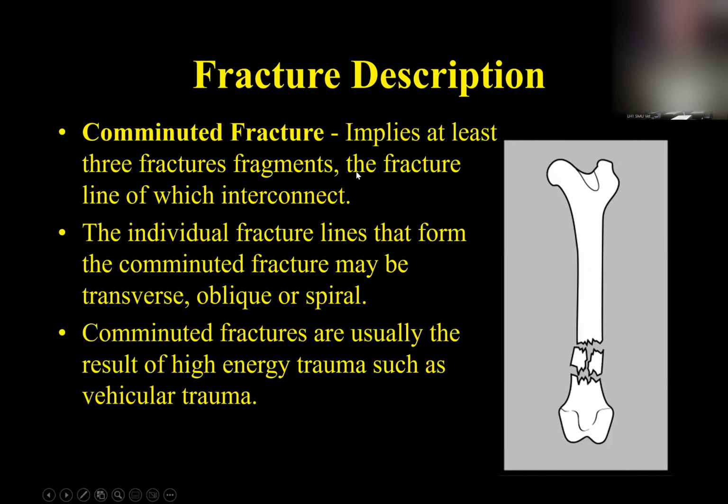Okay, comminuted fracture. This is a term you're going to use a lot. And this is a fracture that has multiple pieces. So here's a fracture piece here, here's a fracture piece here. Sometimes there can be 10 of these. So if it's a comminuted fracture, that means there are multiple pieces involved, not just two fracture fragments. There are at least 3 or more fracture fragments that lead to a comminuted fracture. Okay.